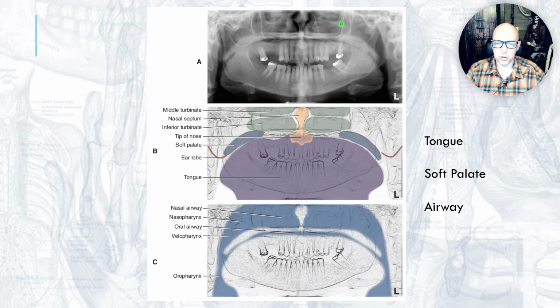And then you see a little gap between the inferior and the middle turbinate. And so I would call this the middle meatus. If you remember, meati are just the spaces in between turbinates, or the air spaces around the turbinates. And of course, that midline vertical thing in the nasal cavity is the nasal septum. A lot of it is cartilaginous, but then you have the bony part of the nasal septum as well. So we're seeing some of both of that. And look at the airspace. Again, there's nothing on an image that you should just ignore.